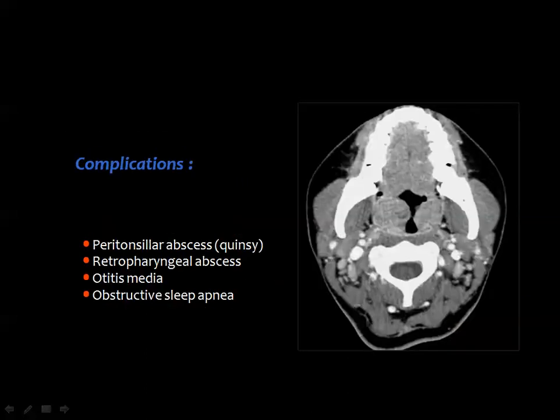This is tonsillitis. Both tonsils are involved. You see the streaky enhancement of the involved tonsil. This is very important to differentiate enlarged tonsils due to tonsillitis from enlarged tonsils due to neoplasm, for example, lymphoma or squamous cell carcinoma, in many times. This pattern of enhancement is highly suggestive of tonsillitis.